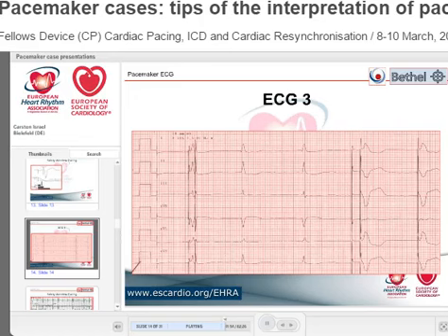You should think of it: atrial fibrillation is frequently undersensed by devices. So there is atrial pacing where it should not be, atrial undersensing of AF, atrial pacing, and frequently this atrial pace is then just at the moment when atrial fibrillation has spontaneous AV conduction. So this happens frequently. Inappropriate ventricular safety pacing should always remind you of atrial undersensing. Here, atrial undersensing of AF, which is frequent.